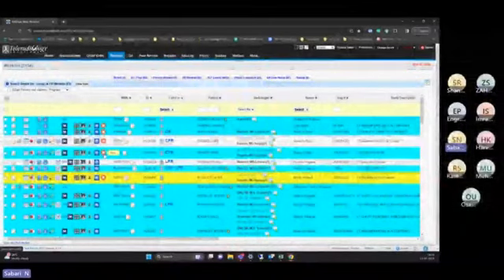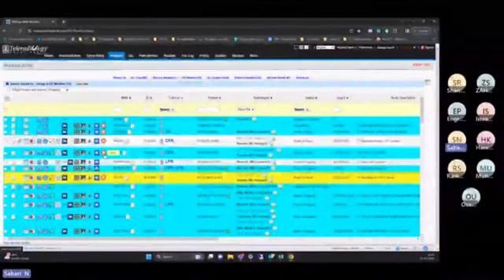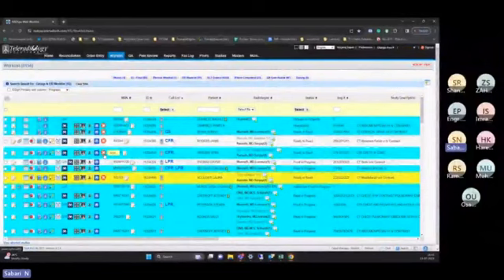So the next option: once we complete the deployment, we will integrate it with the modalities using the AE title, IP address and port number. Once we have done the integration, how will we confirm the integration is successfully done or not? We will push some test cases to the PACS system and check if everything is working, like end-to-end testing.